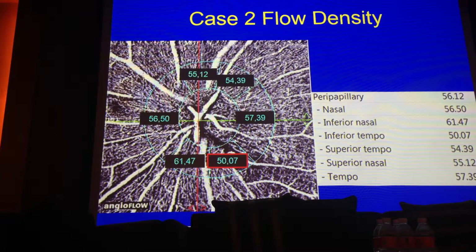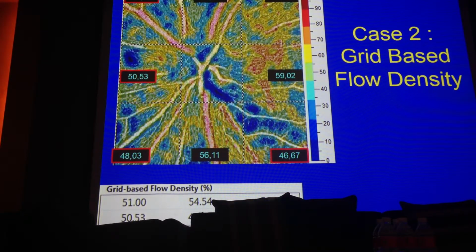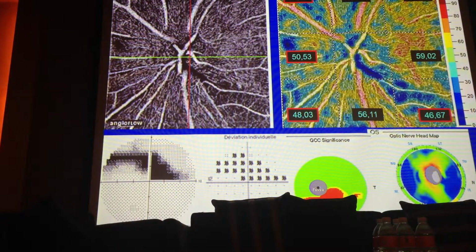follow-up of this patient. So we are convinced that we have to observe a large zone, and you can observe that with this kind of approach, we can have all the detection of the problems. And so probably in the near future we have to enlarge the analysis with a specific approach. This case was just to show you how we can analyze and how we can push other companies to measure and to develop the analysis of glaucoma in this case.